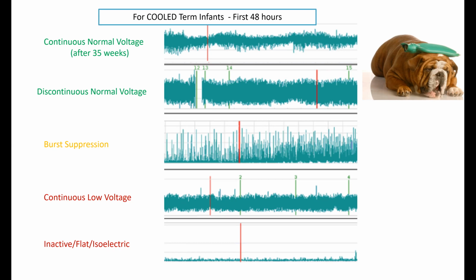If the brain is on the edge of being more unwell, you will see the baby go into an even wider aEEG pattern, a suppressed pattern, almost a burst suppression pattern, where you really start to see the baby's bottom edge flatten out, and the overall voltage trends down. If the brain is well, you will just see that transient suppression for about 30, 45 minutes, and then you will see a return to baseline. So giving those meds, yes, you're treating something, but it also gives you a little sneaky peek at how healthy the neurons are.